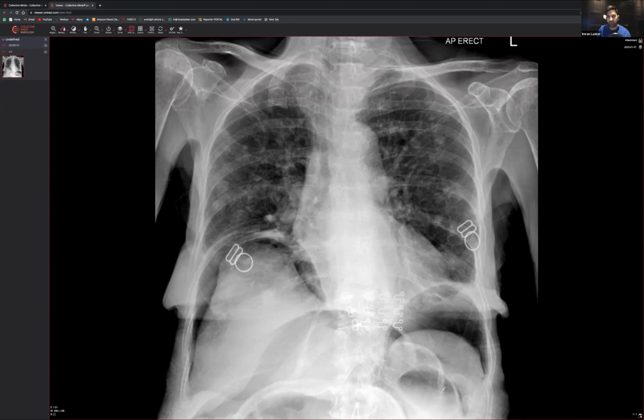Multiple lung metastases. Whatever the case, this person is going to need an emergency CT abdomen pelvis. If they haven't been imaged before, they're going to need a CT chest as well with IV contrast, if the kidneys can take it, to do a full staging scan.